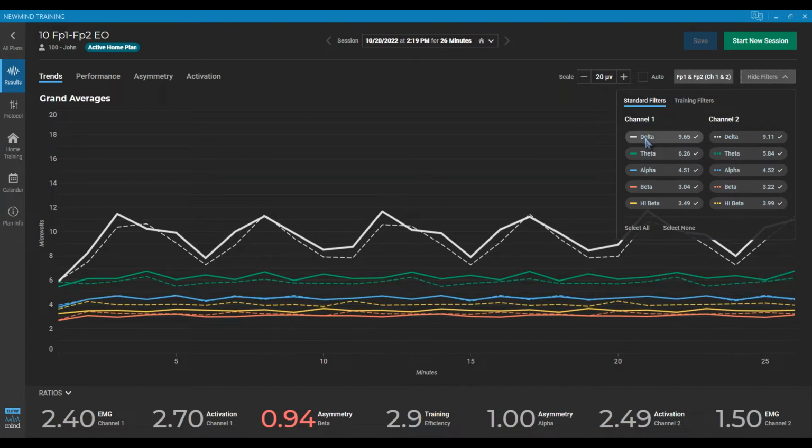And we've listed the frequencies here in an eyes open distribution of power. So human brains with our eyes open, delta should always be the dominant power, theta below that, followed by alpha, and then our beta is at the bottom. So we generally say, delta should be about 12 microvolts plus or minus 4.